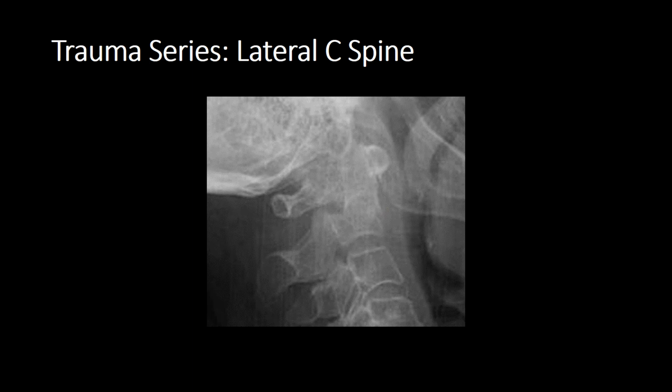And when we talk about alignment in the cervical spine, we talk about the relationship of the proximal vertebra in relation to the distal vertebra. So the C1 has moved forward in relation to C2. This is called a spondylolisthesis. Spondylolisthesis is when you have forward slip of the vertebra onto the vertebra below. Let's have a look at that with the lines drawn in now.